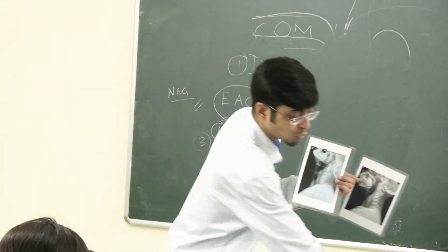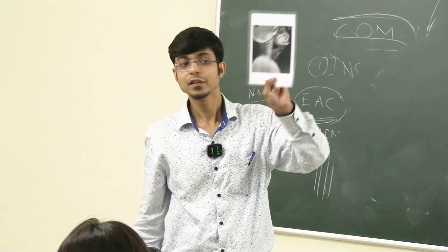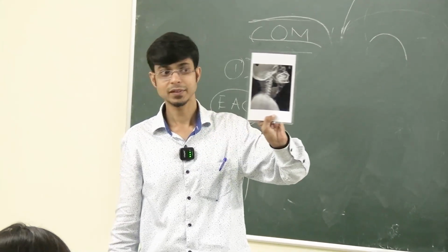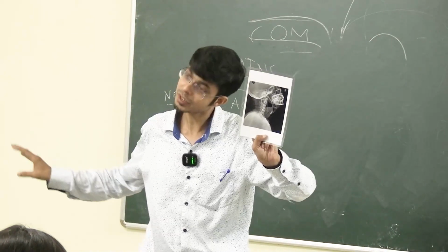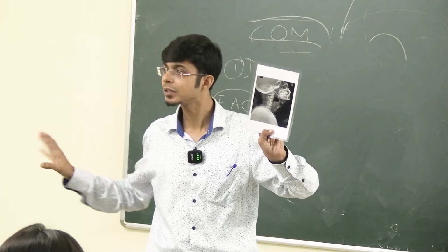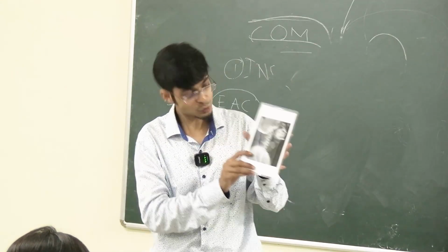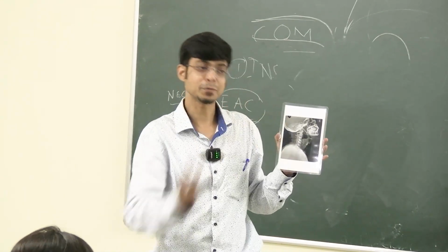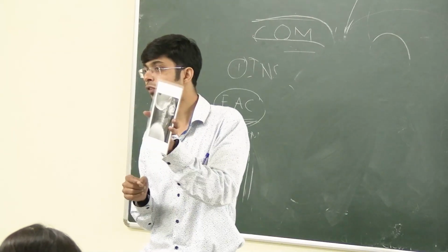Okay, and if you go to the third X-ray, see the bulge. This one is clearly showing air fluid levels. That means there has to be an abscess. That can be a complication of a foreign body, that can be a complication of an otherwise infection, maybe a tubercular abscess, whatever it be. It's a retropharyngeal abscess. So this one where you can see air fluid levels or air pockets, this has to be an abscess, nothing else. Okay, and I don't appreciate any genuine foreign body over here.